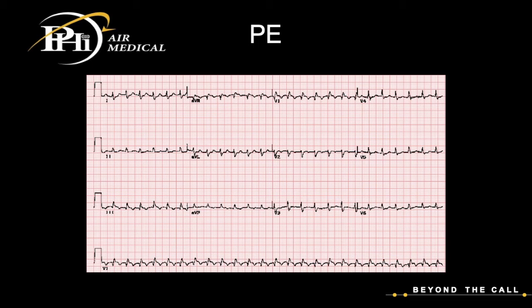But we see that lead 1 is about half up, half down. Remember, we really shouldn't see negative deflection in lead 1 hardly at all, so we're going to call this a rightward axis. I don't see any big disqualifiers. Looking for injury patterns, I don't see a whole lot of ST elevation, but I absolutely see some big flipped T waves in V1 through V4.